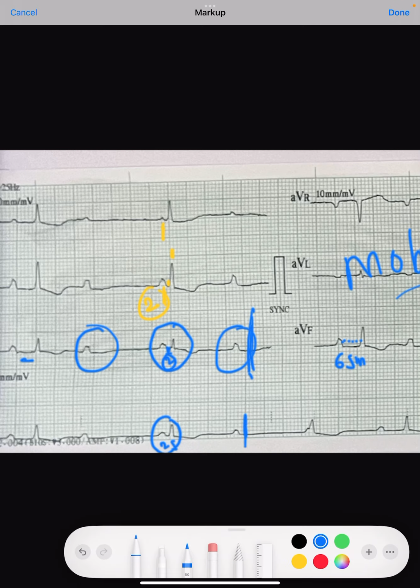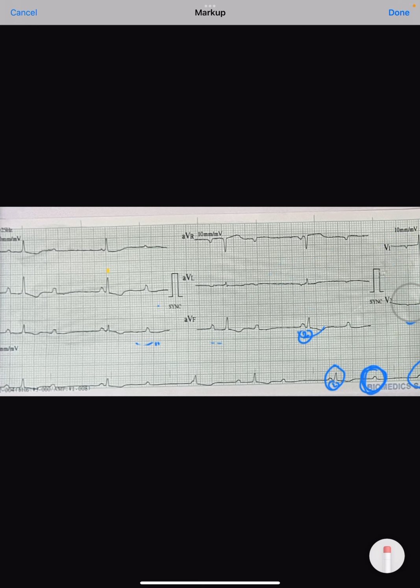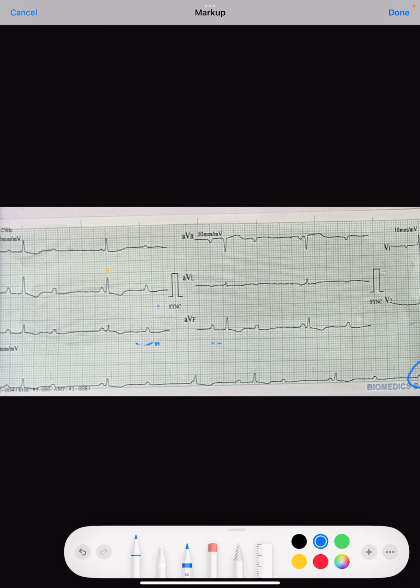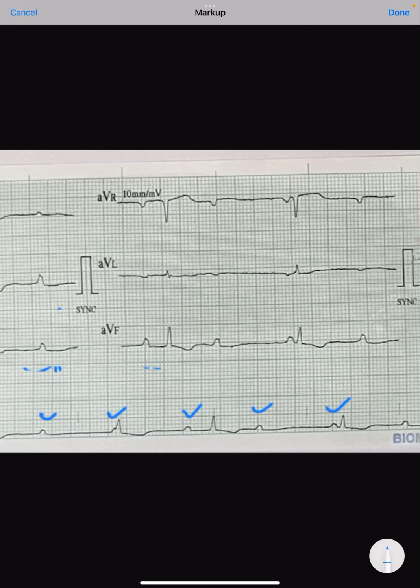What it tells us is that the atria are doing their own work. They are simply producing so many P waves at their routine timing. They are coming exactly after a particular time. Just see, this is one large box, 2, 3, 4, exactly 4 boxes.